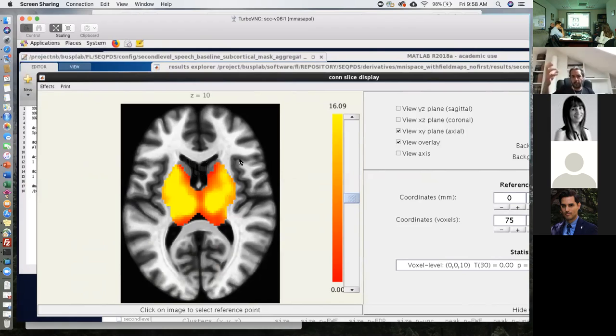The cerebellar position, basically in the inferior portion of it, was varying across subjects. Some subjects were a little higher and lower, and a little anterior and posterior, again, in where the exact border of the cerebellum was, even after MNI normalization, and that basically made the mask that the second level analysis used across all subjects an intersection mask of all of the masks where the brain was expected to be in every individual subject, and that was a very conservative mask. So everything that was at the border of the region that for at least one subject had been considered outside of the brain had been removed.